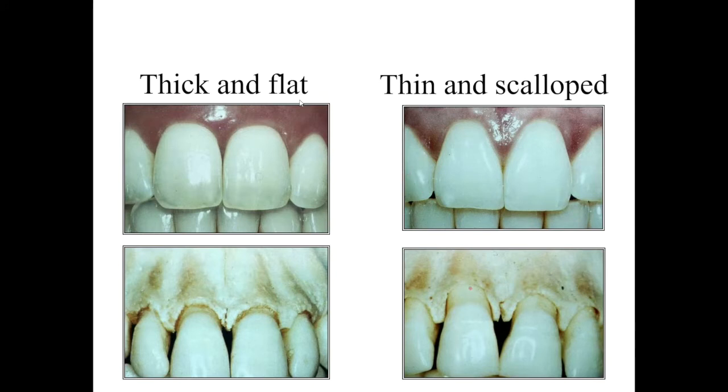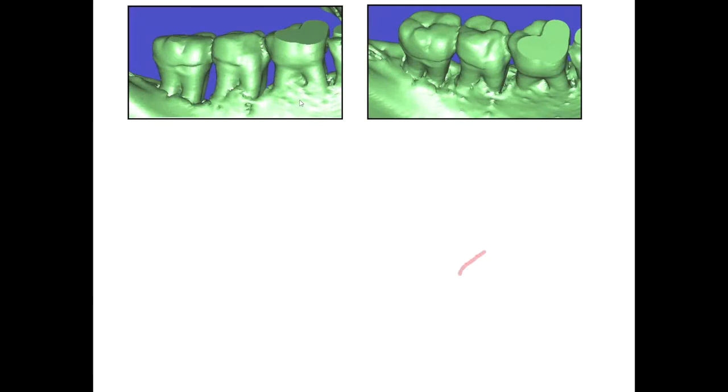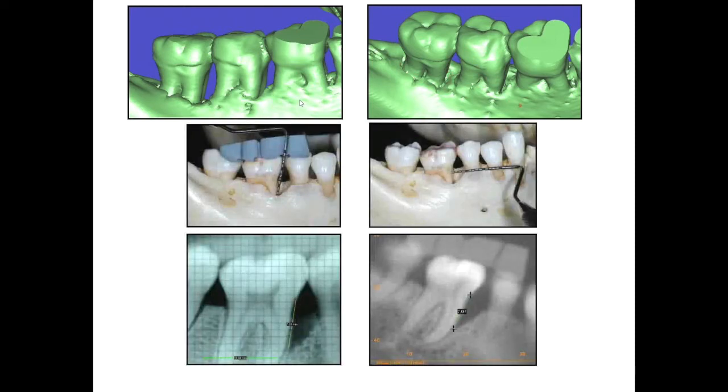It's important to recognize that this distance from the bone level to the CEJ varies from patient to patient, even in normal. So the distance is not always a standard distance. We'll see more of this in a minute, but when it comes to bone level in 3 dimensions, we can very clearly see the bone loss and bone topography around teeth. This is true on humans.